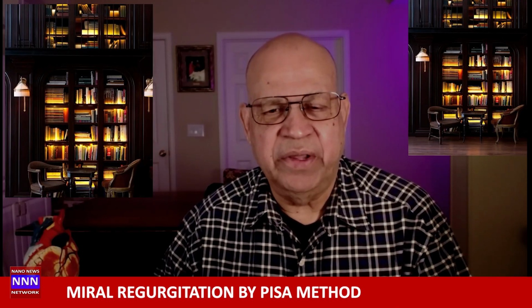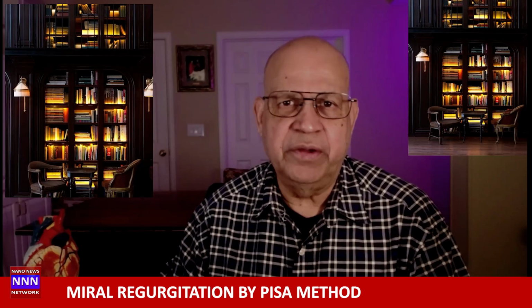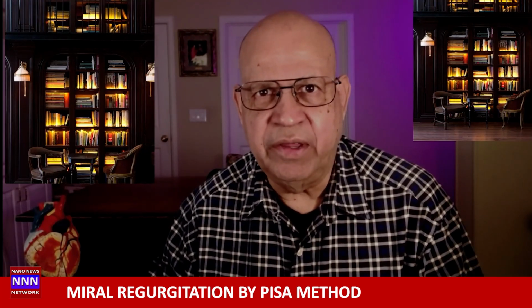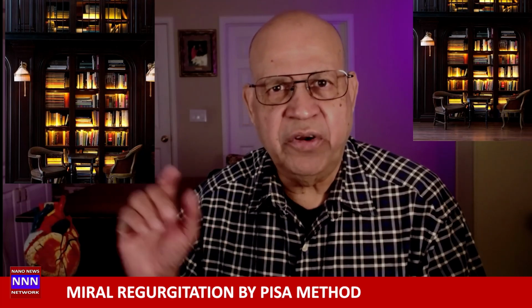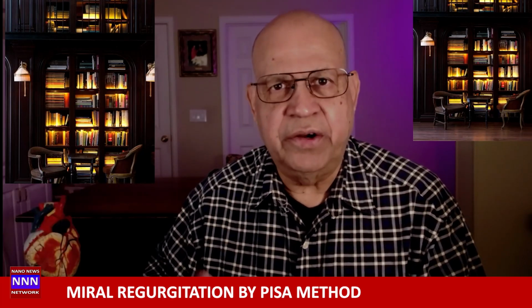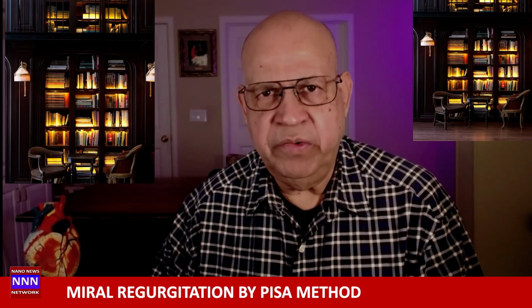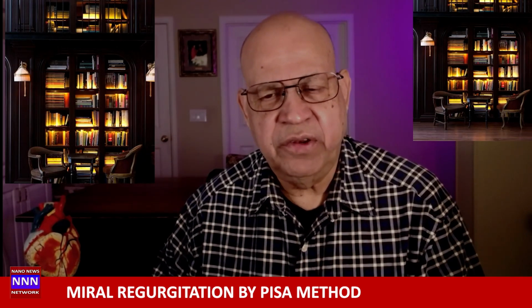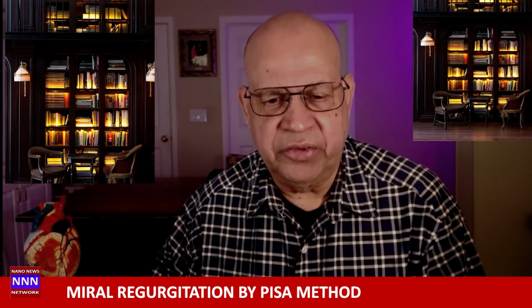I am Dr. Nik Nikam, a cardiologist. In this presentation, we are going to look at how to calculate the amount of mitral regurgitation using PISA, proximal isovelocity surface area. Proximal isovelocity surface area using color Doppler to measure the mitral regurgitation volume, mitral regurgitation fraction, and also assess the degree of mitral regurgitation.